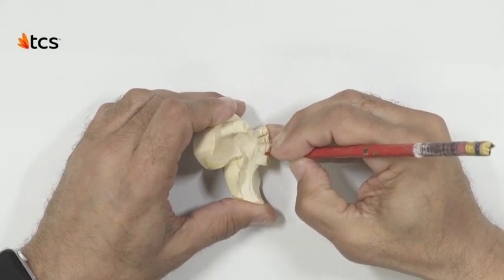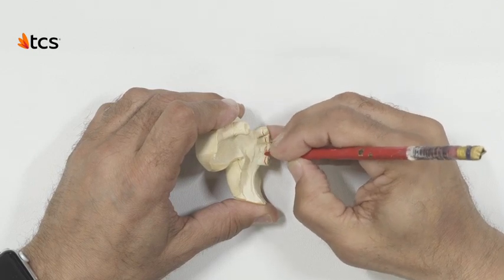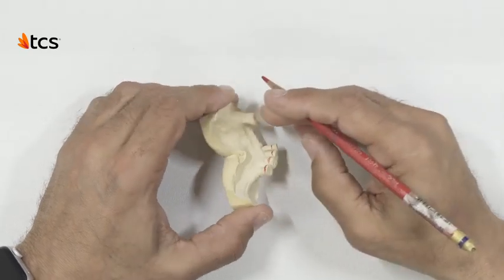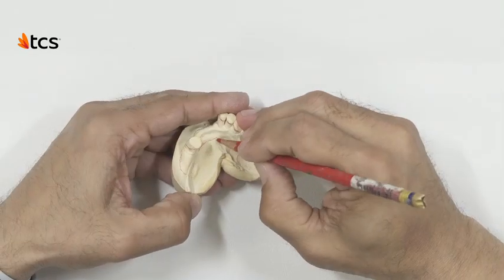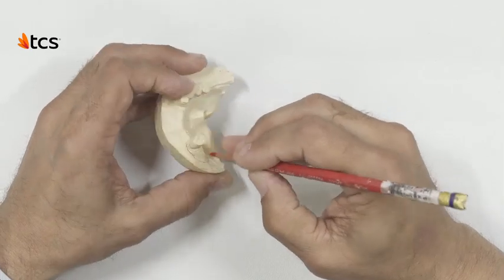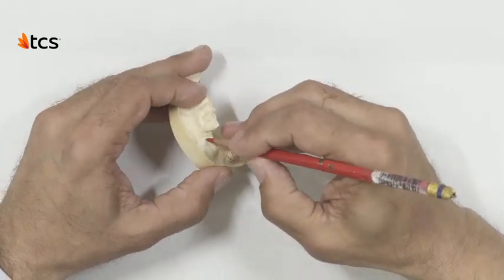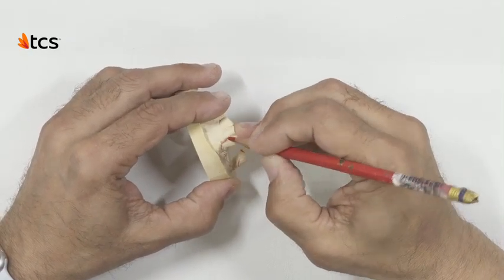As indicated in the previous design demos, we followed the basic design rules, going above the height of contour on the posteriors, up the cingulums in the anteriors, and avoiding the buccal fold areas. When clasping, as usual, we constrain from bony undercuts and we conceal the facing of the tooth with enough coverage without exceeding 2 millimeters from the cervical line.